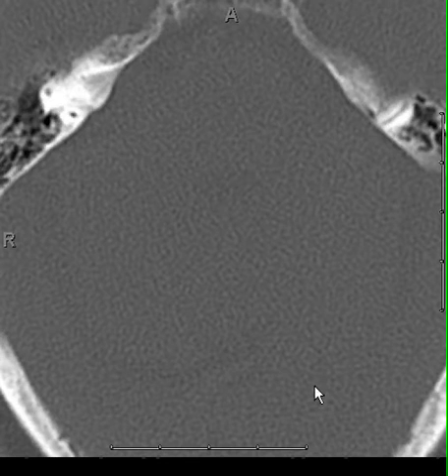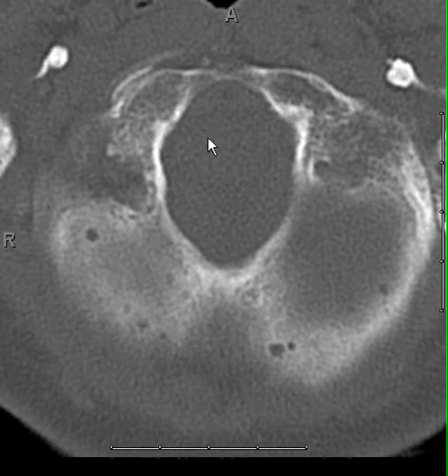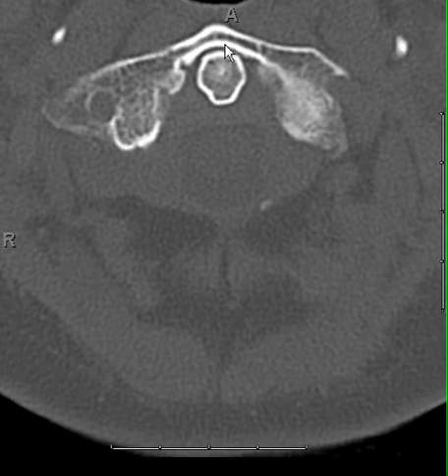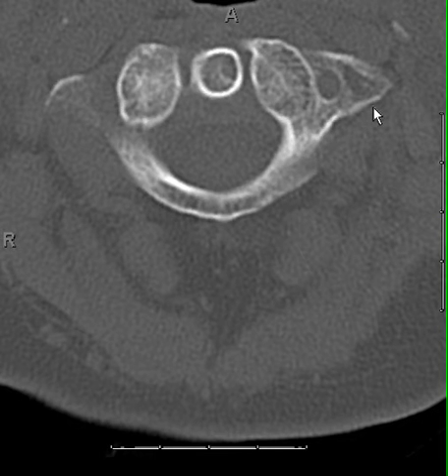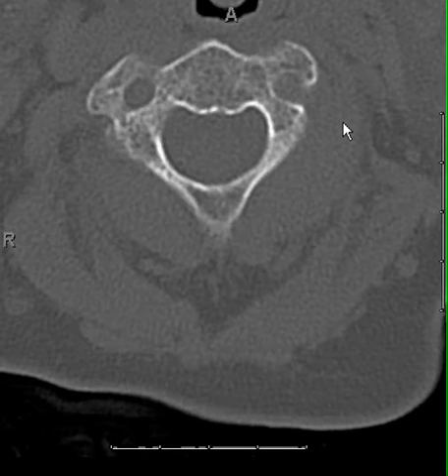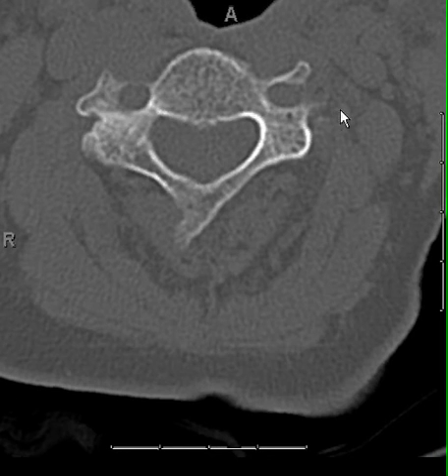So now looking at the axials, scrolling down from the top, here's the skull base, there's the occipital condyles, C1, there's the dens, so C1, 2 interval is totally normal. Now we're also going to be looking at the neural foramina, the transverse foramina, because the sagittal images don't show you those fractures very well, and they do put the vertebral arteries at risk.